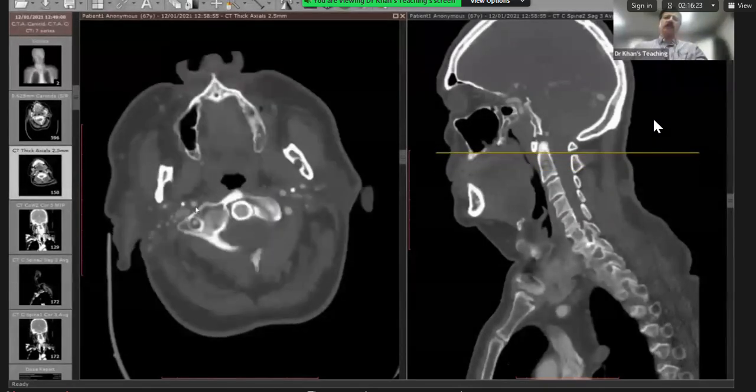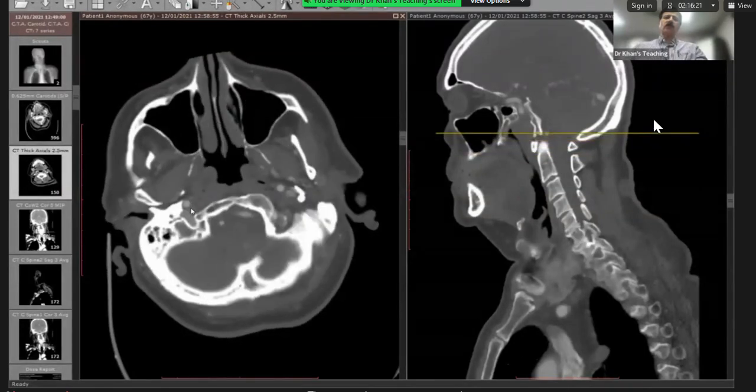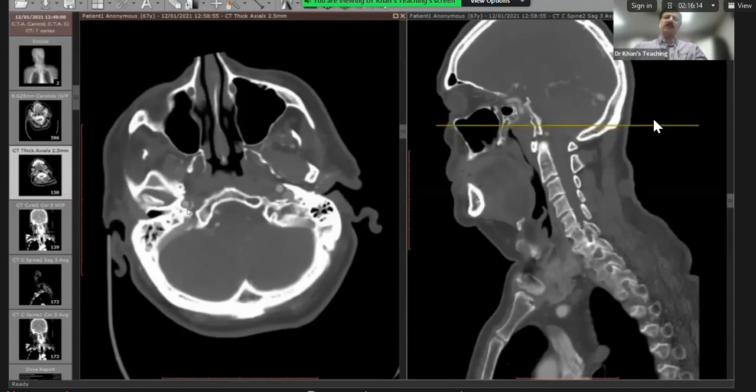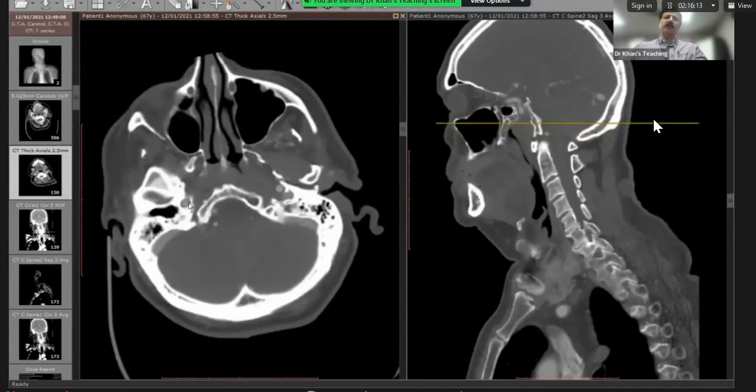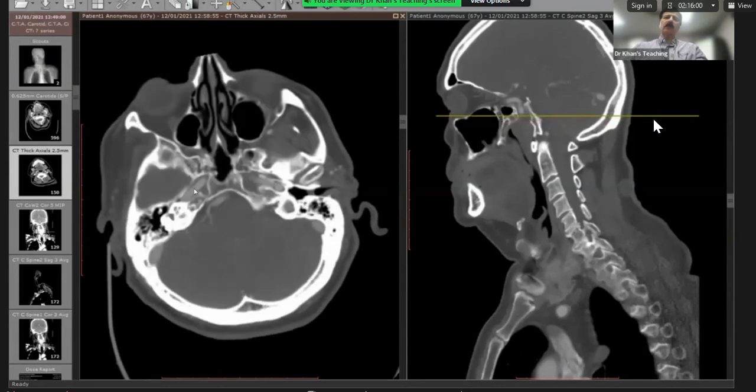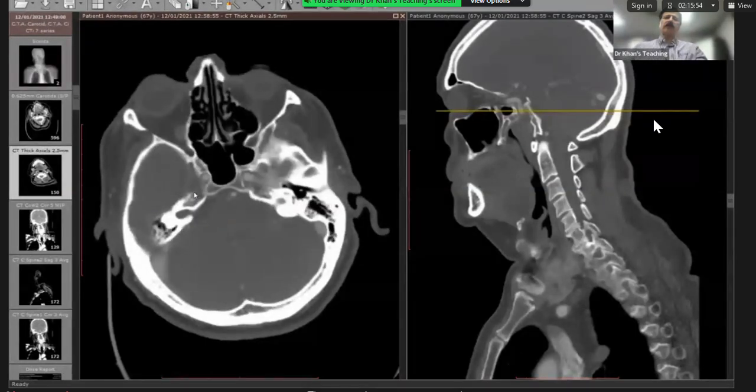And now this carotid artery, the internal carotid artery, goes superiorly and it is touching the base of skull. And here, this is the vertical portion where you can see it as a cross section, because this is the vertical portion of the carotid canal, as we had described. Now you will see it will become horizontal. Now it has become horizontal. It is passing through the petrous part.